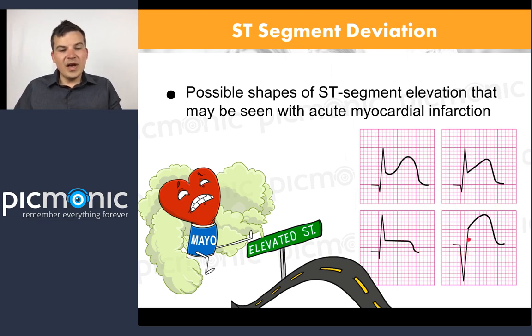There's no P wave in any of these. That's on purpose. But QRST, QRST, then we got a QRST. So it's going to look different, and it's based on the evolution of the myocardial infarction itself.